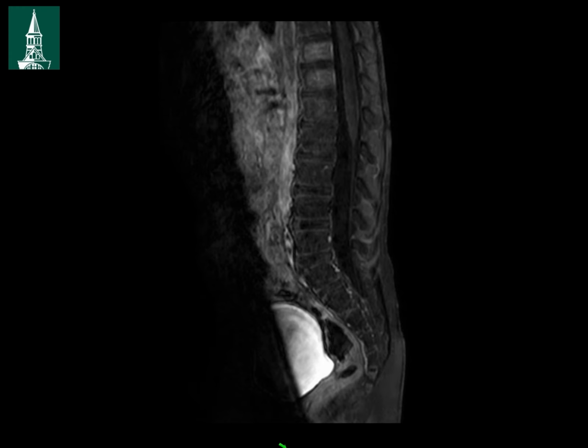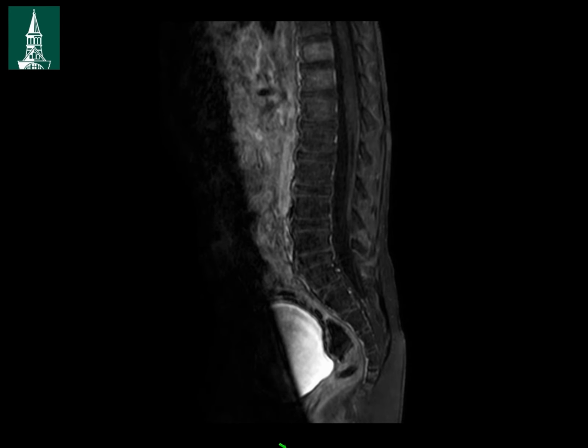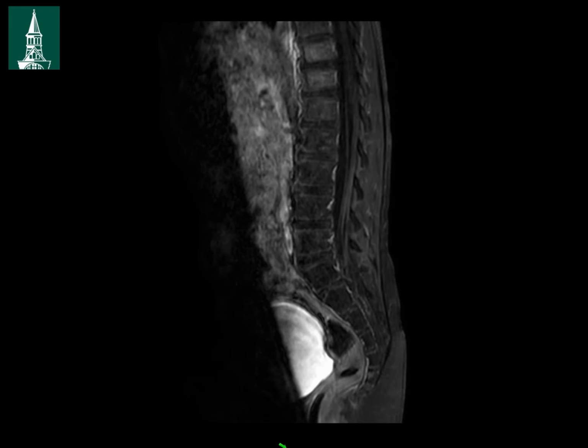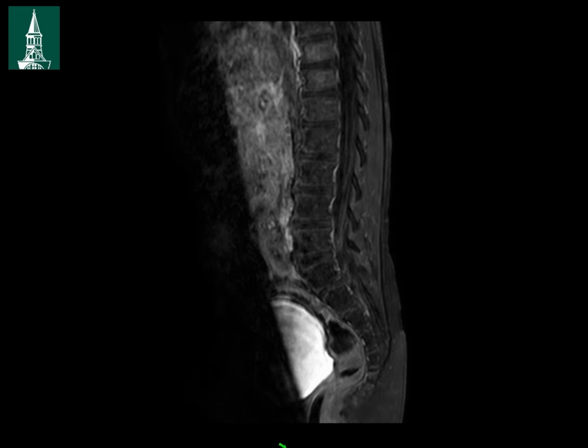You can see the fat saturation is beautiful here, but this is a young, small patient, so we get really nice imaging with this sequence as we come through all the way to the end of the other side. You can very clearly see those nerve roots of the cauda equina coming down. Really nice visualization. If there was something there enhancing along those, we would see them really well. And I feel more confident now reading these as 3Ds than I did with the 2Ds, including the axial acquisition. So I think it's a win-win for everyone.